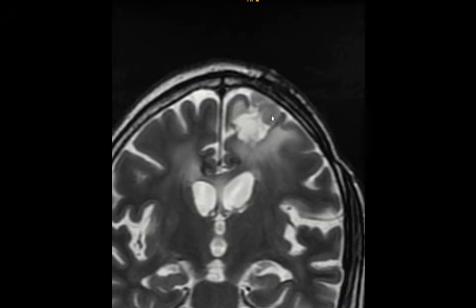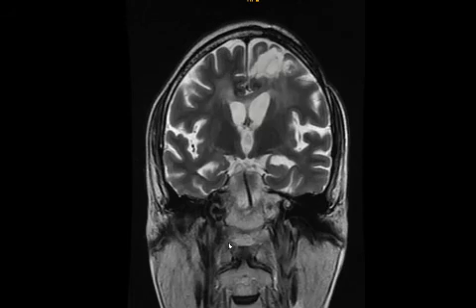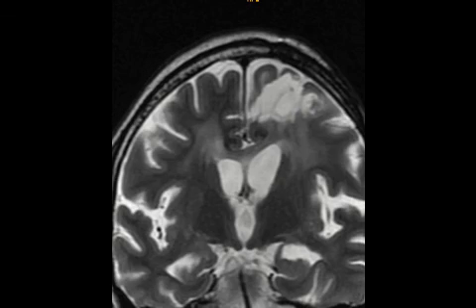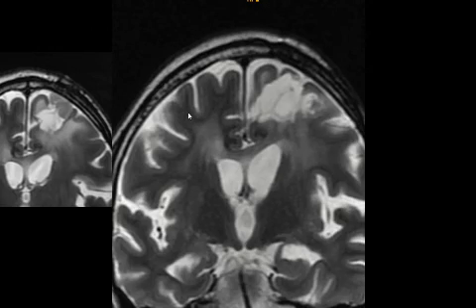I will just check it out once more to show you. And look at that. This is the same slice.